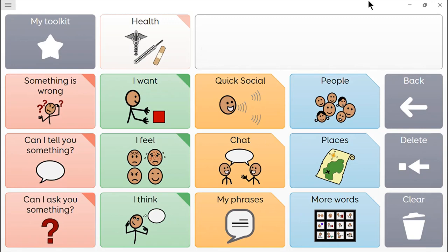And then another thing is just that there are some things about this that I don't think are perfect that I would like to change or tweak, and I just love your feedback to see what you think needs to change. So this is not the final option. There's some programming that can still be done.